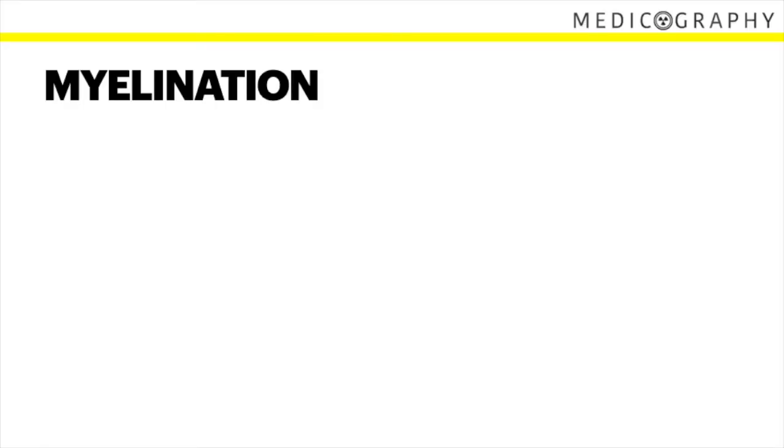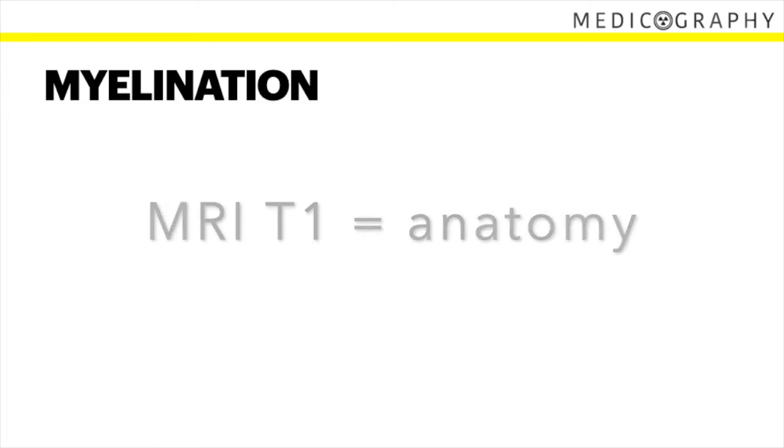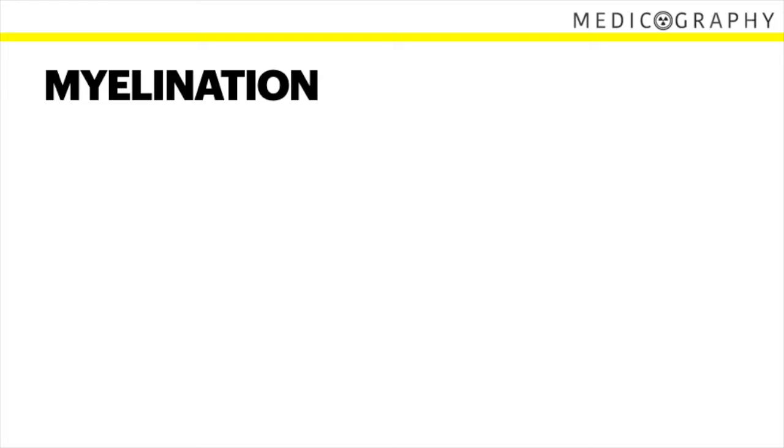So if you remember, or if you're still in radiology training, I mean residents, well, our teachers always said that on MR, the T1 represents anatomy. We always have to look at the T1 sequence to know the anatomy. It's simply a reminder, something to remember, that white matter is whiter on T1 and the gray matter is grayer in color on the T1 MR. And that's basically the anatomy.